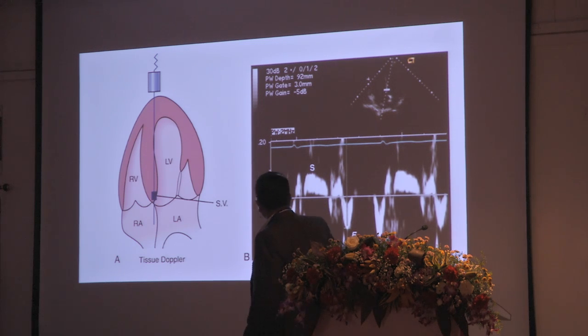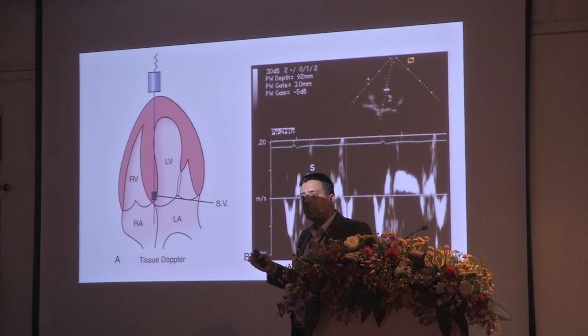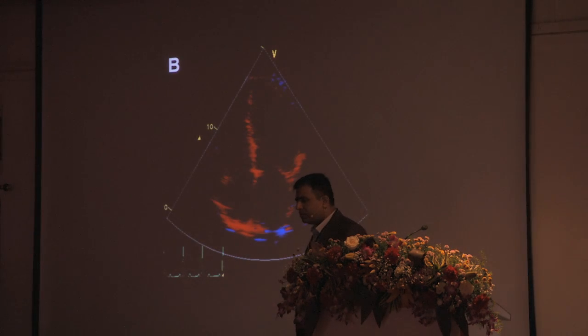So exactly what you do, the E prime and A prime is measuring the annular velocity, and that is the first form of tissue Doppler that came about. Now, they took that one step further. They said, well, how do I conveniently do this for the rest of the myocardium? And then you came about what you call parametric imaging.